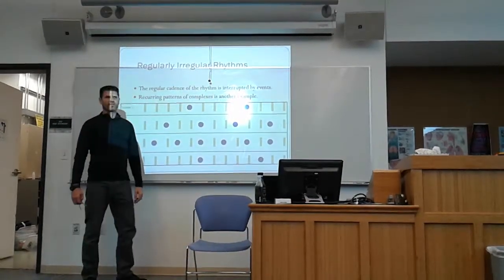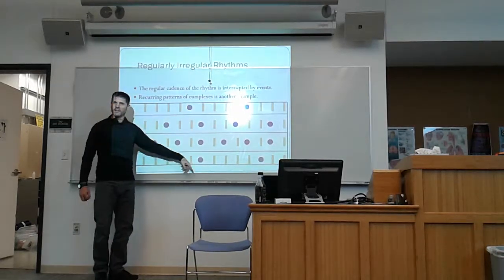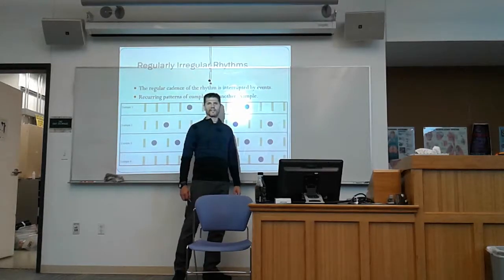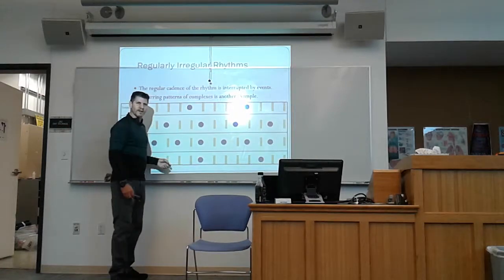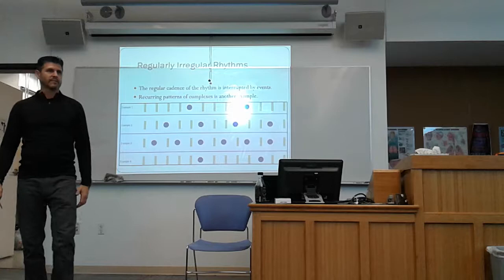Oh, well that's not normal. But I go one step further and it's back to 5 and a drop, 4 and a drop, 3 and a drop. Oh, that's interesting. I get a little bit longer strip, and all of a sudden I see it's back to 5, 4, okay. So that also has a pattern to it.